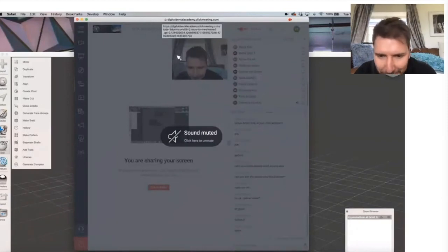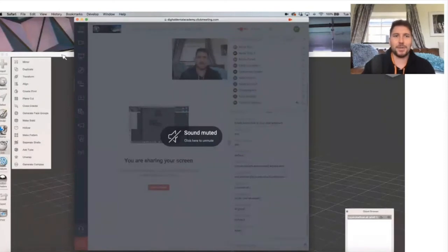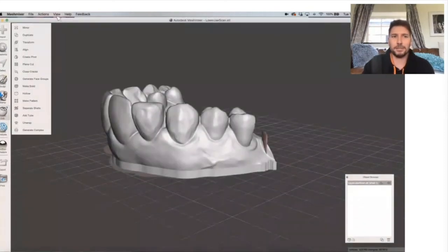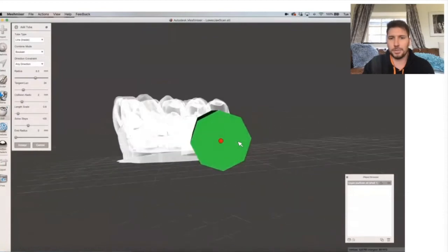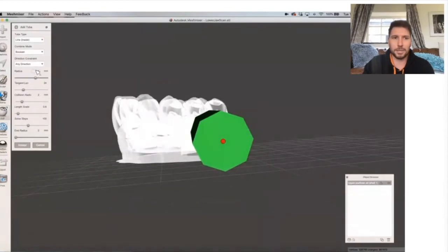Yes. Well done, Theodora. Excellent. So, yeah, we want to add a few tubes for the resin to flow out of. And that's, again, really easy. It's got a function here. So add tube. And look at that. That's huge because I've been doing it making ventilator parts. So we don't need it that big.